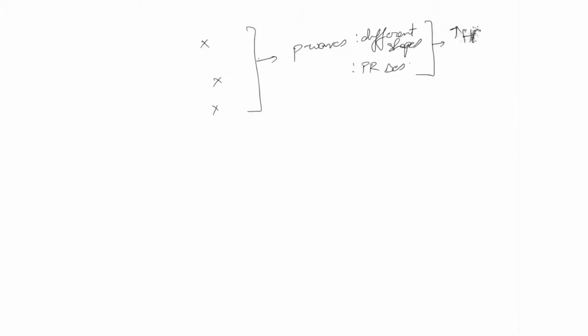Now, sometimes, especially in people with COPD, you might see that the origin of the high heart rate is from several different foci within the heart. And so you see P waves that are all different in shapes. So the P waves are of different shapes. And in addition, the PR intervals constantly change. So when you see this and the heart rate is high, you would call that multifocal atrial tachycardia.